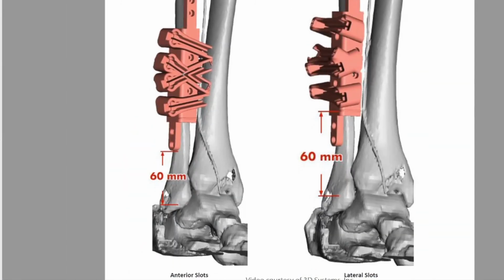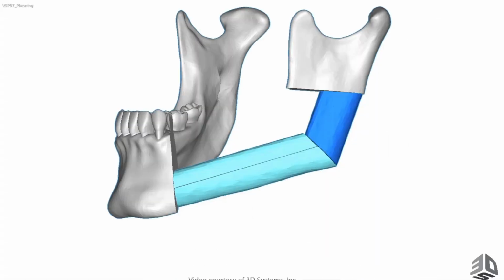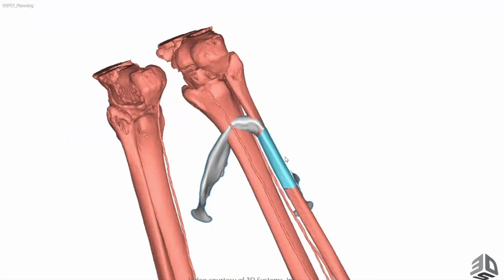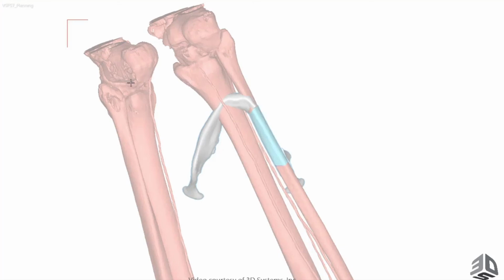So can I see the cutting slots in relation to the fibula on the reconstructed mandible, please, just to see where they lie? So what that would be is, let me go ahead and bring that up here. If I was to pull this down here and also bring up that leg for further reference, we're looking at the posterior surface of the left leg right now.